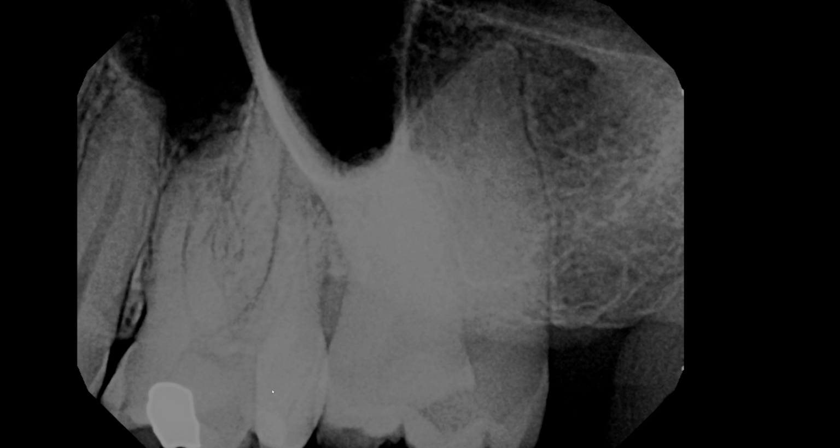Do you see that this part of the crown is more radiopaque than this side of the crown? That means there's a superimposed portion of the crown or the tooth. So now you can see that the PDL space of the other tooth goes something like that. It looks like it may have lost a portion of the crown. So here's the other tooth. So here we have 1, 2, and 3 molars.